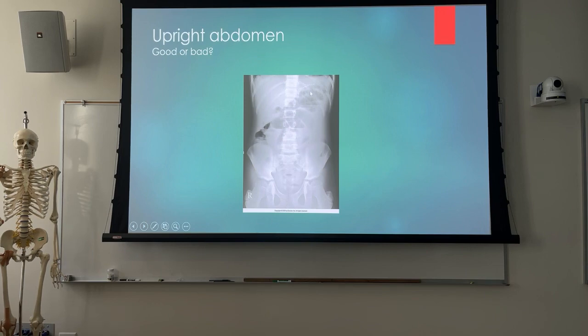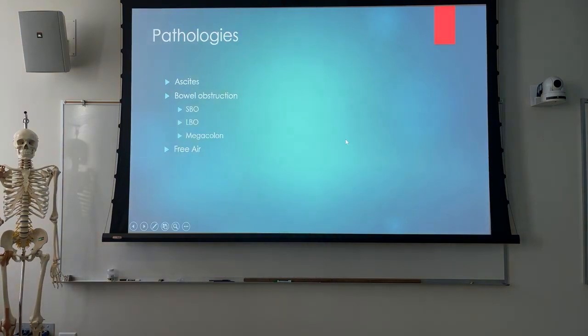And we do see evidence of air fluid levels, so this is probably as good as it gets. I wouldn't go back and collimate and shoot this patient again just to get rid of some of that, right? That'd be counterproductive. So just do better next time.